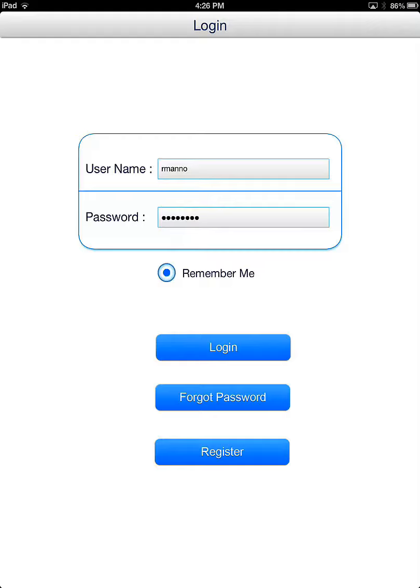Before I get started, Ortho Expert minimum requirements are iPad 2, iPad Next Generation, or iPad Mini. It is highly recommended that you enable cloud backup to your device to avoid accidental loss of patient data.